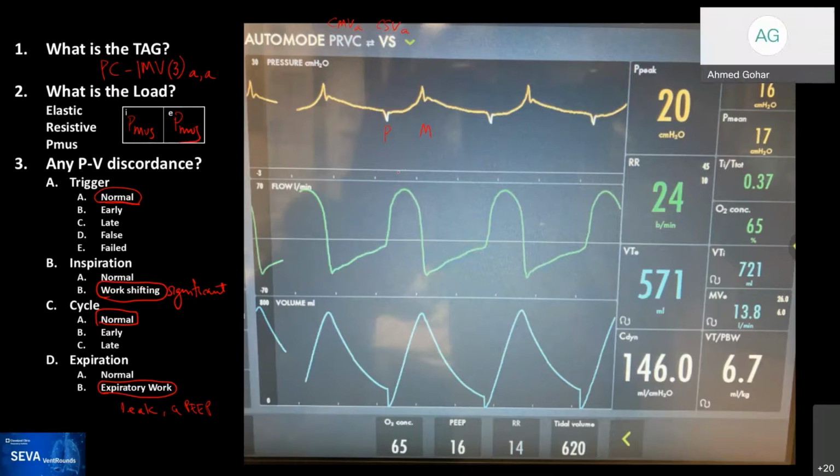Yeah, I think again, it has to do with, as you mentioned, that the length of the breath is pretty much the same with every single breath to start with. And then when you look at the size of the breaths, it's more or less the same. So in terms of pressure controlled mode, for the most part, I look at the inspiratory time. That's how I determine, because the size of the breath or the volume can be variable. You actually expect it to be variable. But as you pointed, it's quite interesting that to the contrary here, it's not. But because the I time is equal in every breath, that's why I said it's machine cycled.